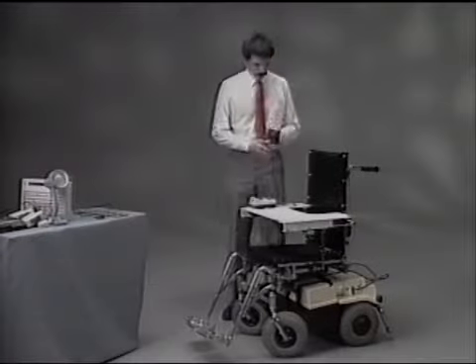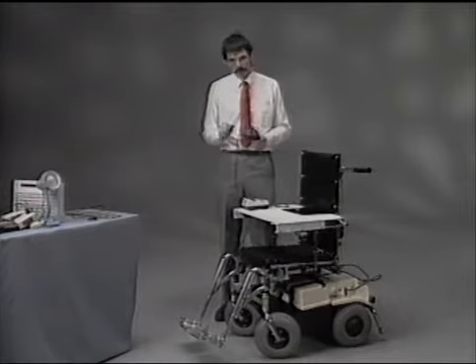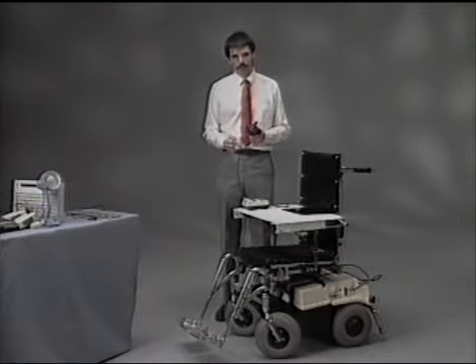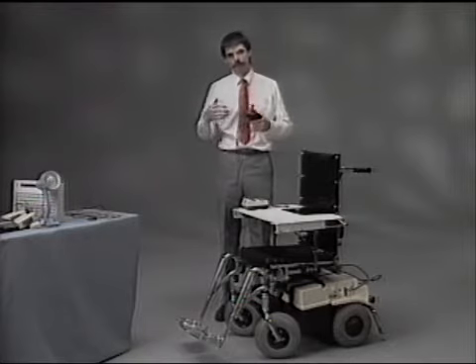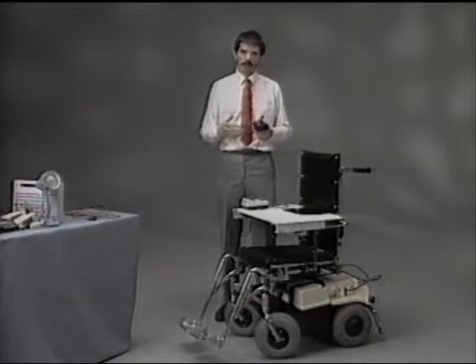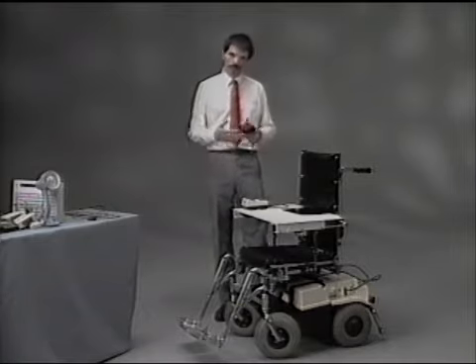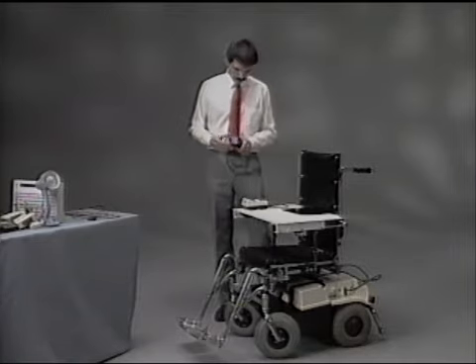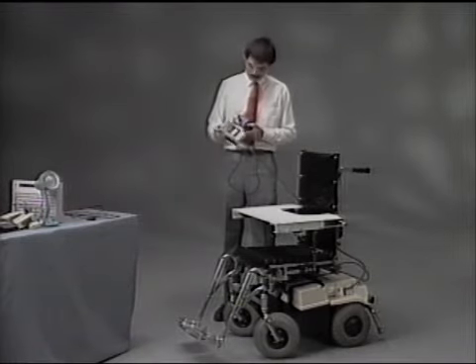We have a power wheelchair that we spend a lot of our day in, in fact about 14 hours, that allows us to get around our environment. What we want to be able to do is turn on and off things in our environment. If we're at home, we want to be able to turn on and off the lights. If we're at a work site, we want to be able to turn on and off maybe a computer that we're working with. We want to be able to do that from our power wheelchair. So this power wheelchair is designed with an environmental control system built into it.